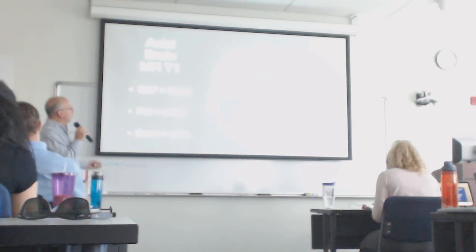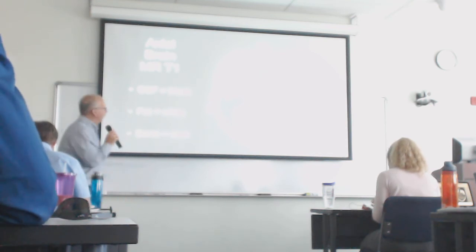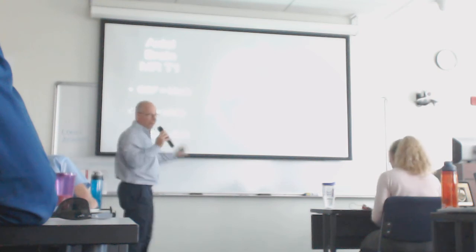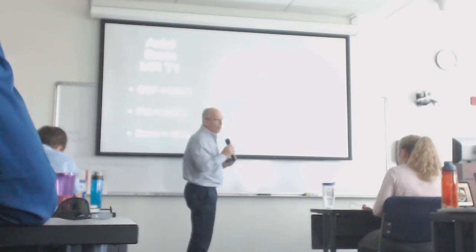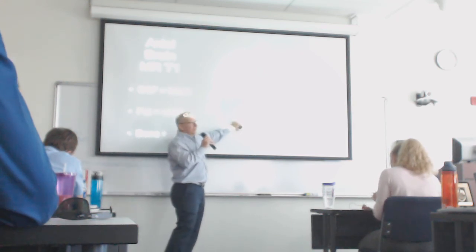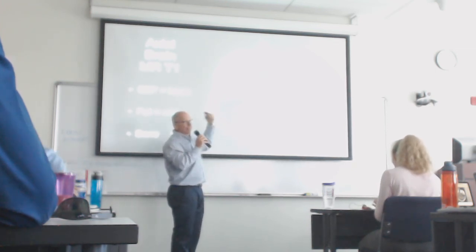Okay, so here's an MR picture. If you were to look at that, you would say that's a CT, right? How can that not be a CT? It's not a CT. It's an MR. It's a T1 weighted MR image. I'll tell you it's a T1 weighted MR image. I don't want to try to explain what T1 means, but on T1, fat is bright. Fat is bright. Soft tissue, brain parenchyma is gray. Bone is black.